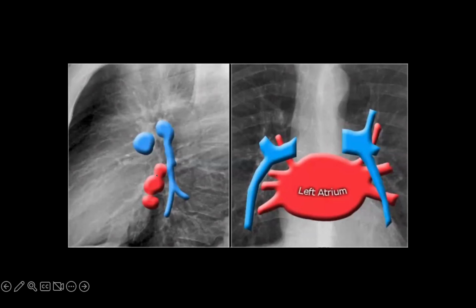And these are the pulmonary veins, which you can see sometimes arising from the left atrium and oriented horizontally compared to the vertically oriented pulmonary arteries. This is a very nice point to remember. It's really practical, particularly when you have just an abdomen CT, and you're looking at the lower cuts of the chest, and you see pulmonary embolism, and then you're thinking, is this within a vein or within an artery? Because you don't have the upper cuts, obviously, right? This is a very practical point. If the vessels are oriented horizontally, those are veins. If they are oriented vertically, those are pulmonary arteries.